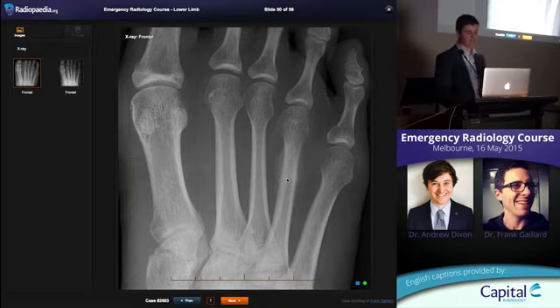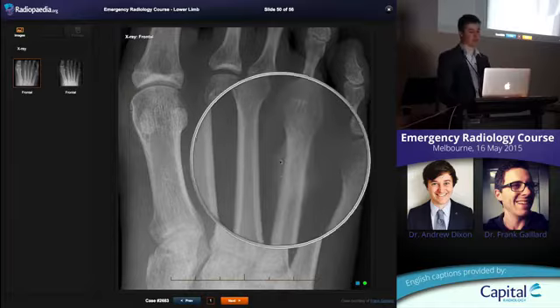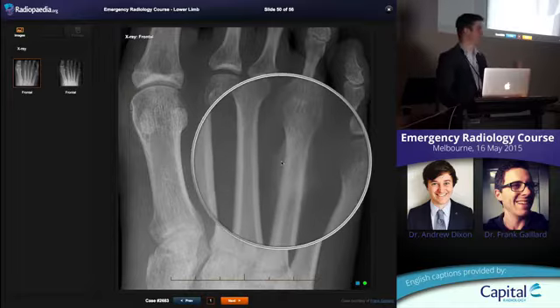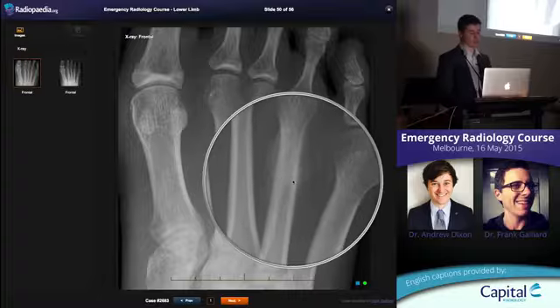You might not necessarily see the fracture, but you'll see periosteal new bone if the stress response has been going for long enough. You get this fluffy kind of bone. If it's fluffy like this, that means it's active. It's chronic, it's actively trying to heal the stress that's in the bone, the micro-fracturing. There's probably a subtle fracture going through this one.